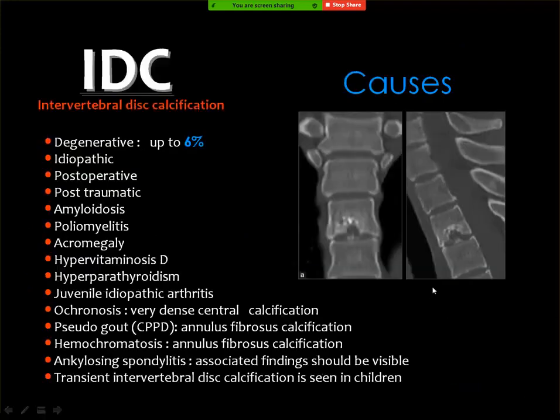But recently, it is presented in the literature, and they spotted a lot of causes that may lead to calcification of the intervertebral disc.